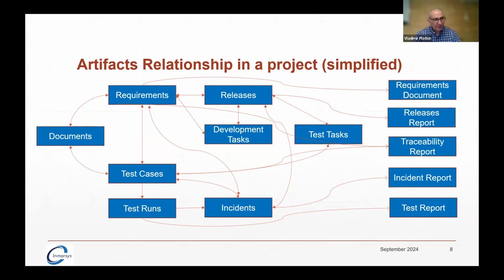So that's why I'm making my requirements really atomic. So pressing the button, this light shall come on. That's it. Then requirements are linked to test cases. That's a primary thing for Spira. And I believe that Spira has been created for test people in the first instance. Version 1 probably was created for test people. And then they bolted on requirements and bolted on some additional functionality. And then test cases, when they are organized in groups and test people create the test run and then they run it and generate a report. So test runs, once they finish, they're immutable.